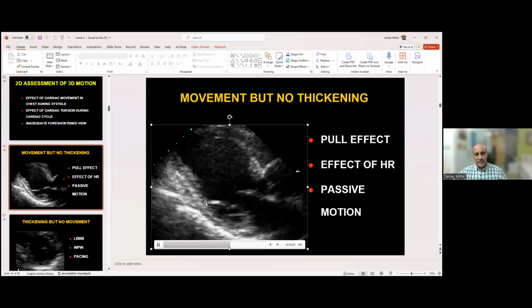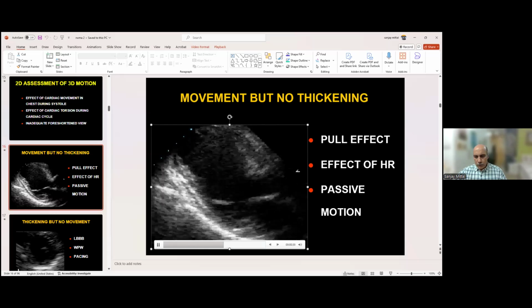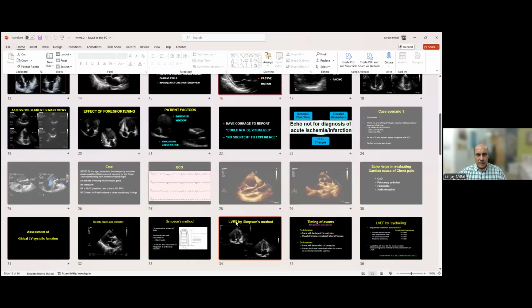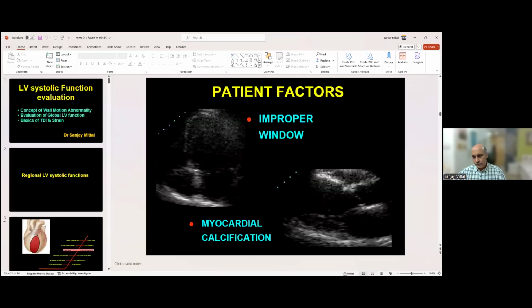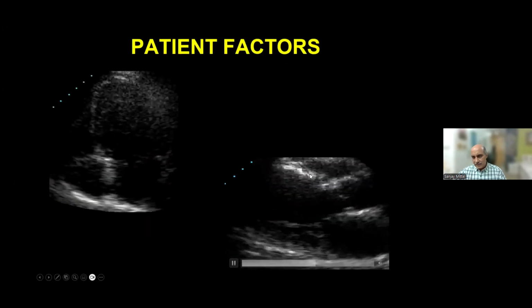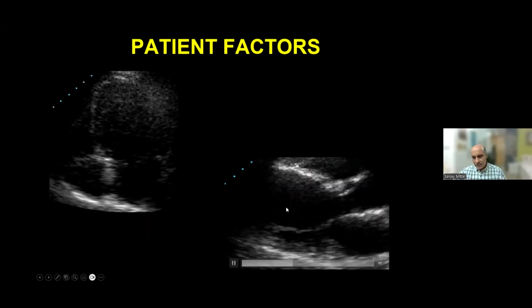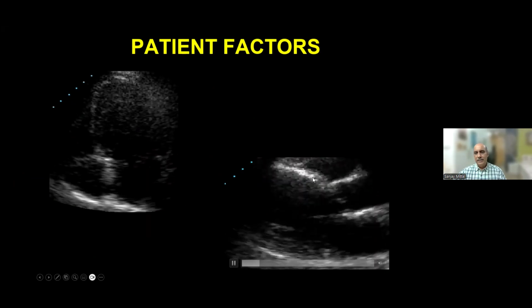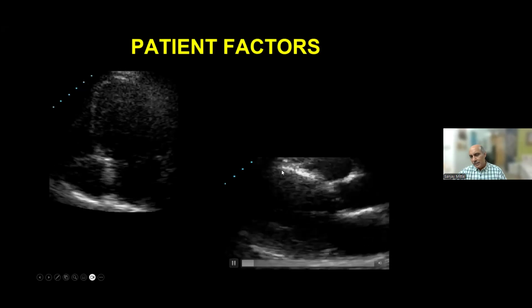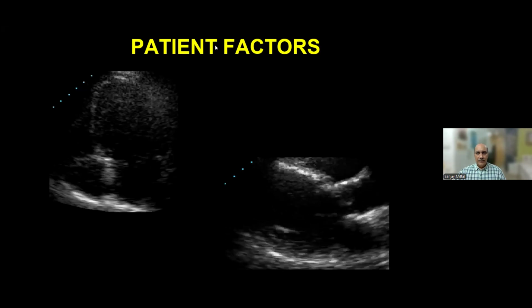What would happen is in the scar, the muscle area would appear like this. I'll show you an example. That was a little calcified area. See this? This is the scar. This area is scar. This is muscle. This is scar. Okay? Thank you, sir. It's calcified specks also, which is causing poor visualization of the endocardium in this particular place. All right? Yes, sir. Thank you, sir.